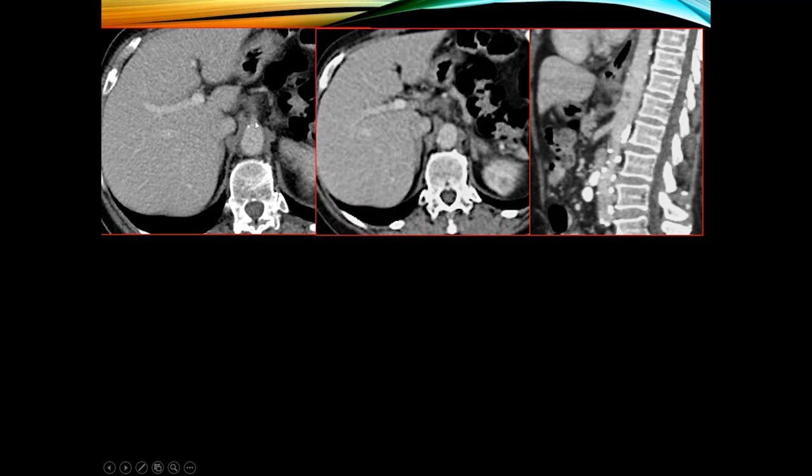It was missed several times, where it looks like there should be a celiac artery coming off here, and you see what's a ghost of a celiac artery, but it's really filled in with soft tissue, or at least a filling defect. SMA remains patent.